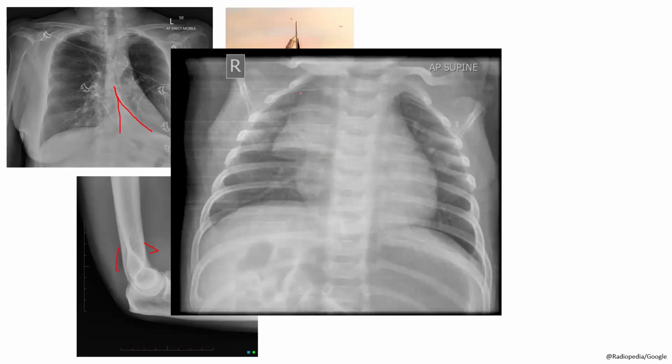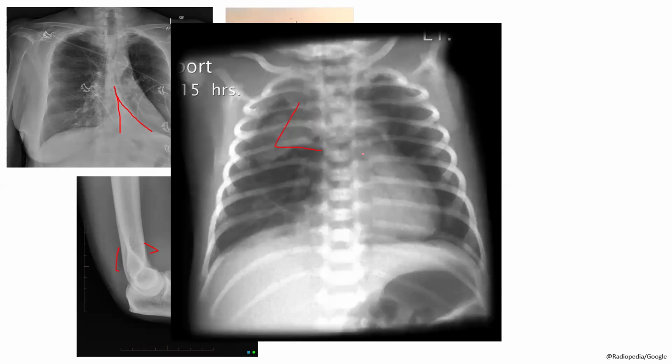Normal thymus in a pediatric patient can also give sail-like appearance. So this is thymic sail sign. When there is pneumomediastinum, the air lines the thymus completely, and it gives an angel wing type of appearance. So this is angel wing appearance of pneumomediastinum in a neonate.